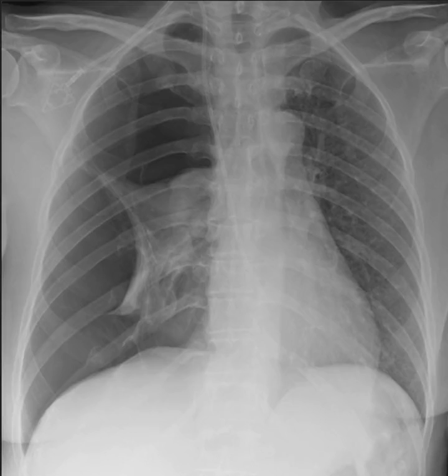A very impressive chest x-ray. And this is not one that you'll see very commonly. So let's go through and break it down. All right, now let's start off by looking at this side first. This is a patient's left side.